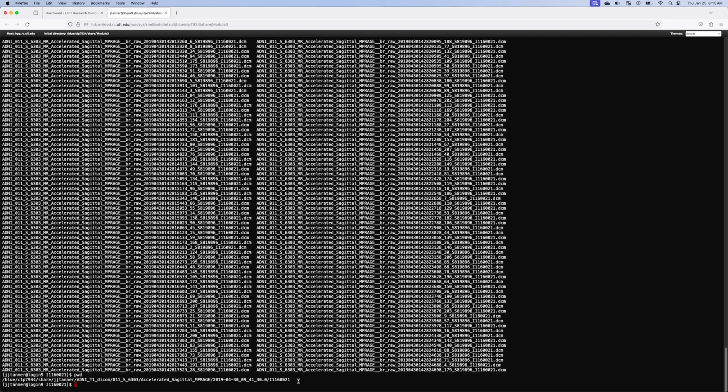And so what I'm going to do is go back up to this level. Now there's different ways to do it. I could cd up a few times with those double dots, or I could just select and this will auto copy that path.